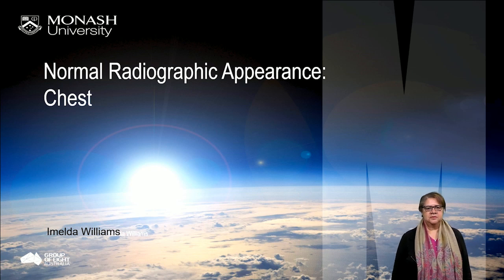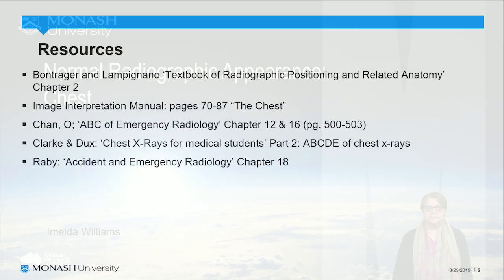This presentation will focus on the normal radiographic appearances of the chest X-ray. It's important that you apply a systematic approach when you view chest images, as the chest is quite difficult to interpret. If you apply the systematic approach, it will help you to avoid pitfalls.